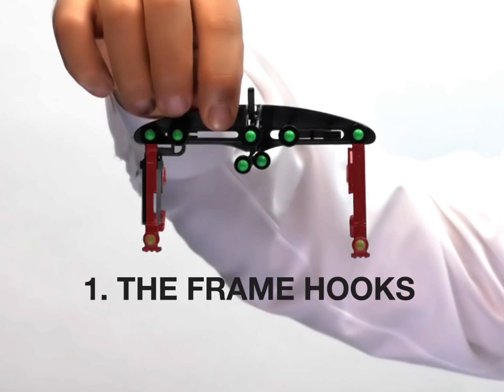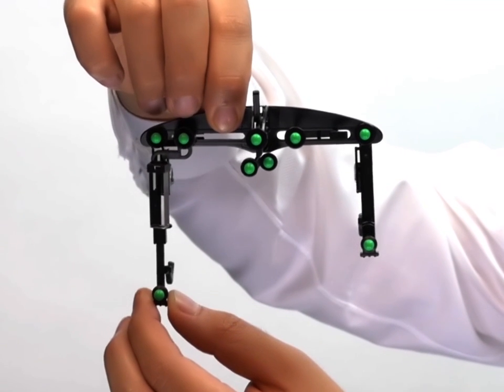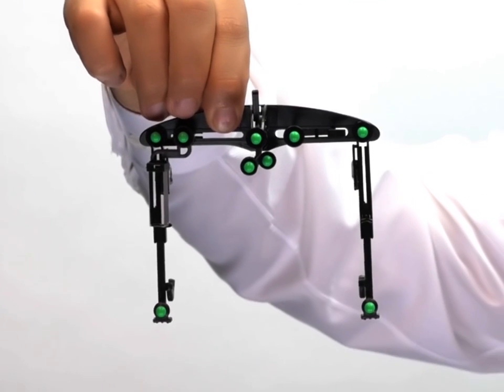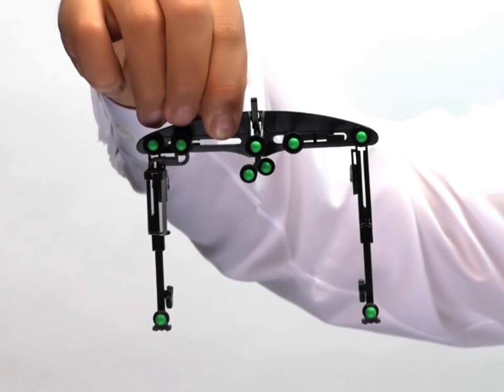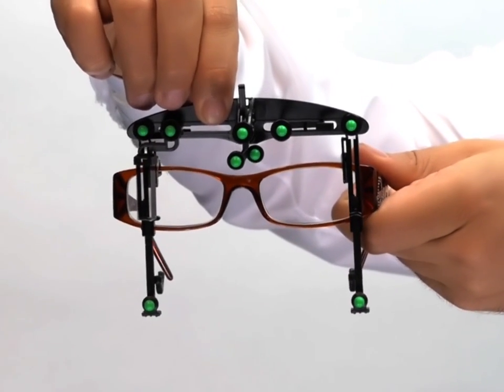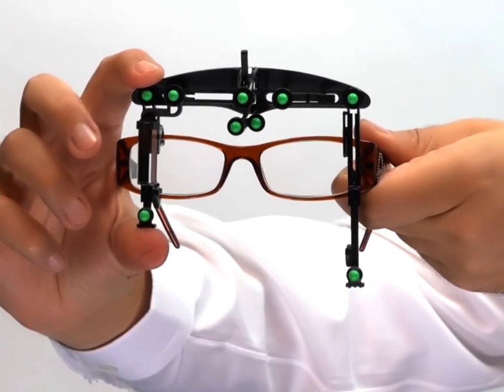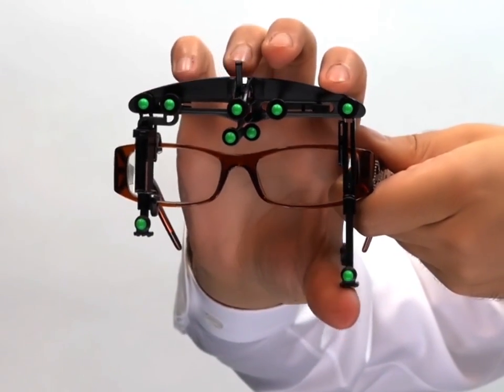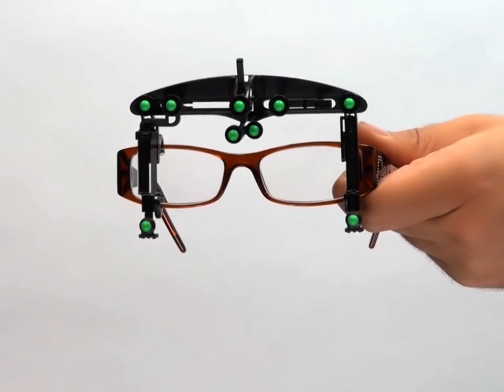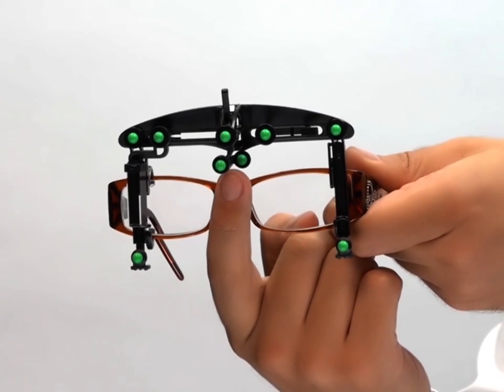The frame hooks are located behind each leg. Extend the legs by holding the bottom edge of each leg. Insert the frame between the hooks and then close the legs to secure the frame in place, making sure that the EY stick is centered on the frame. Note that you can use the swing assembly as a point of reference to help guide you in centering the EY stick to the frame.